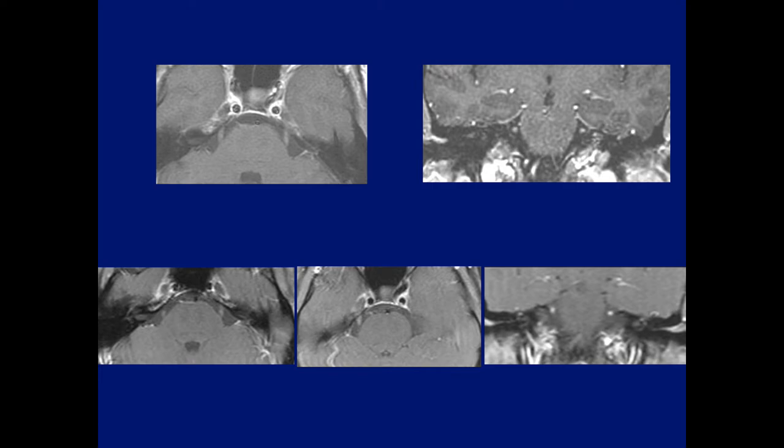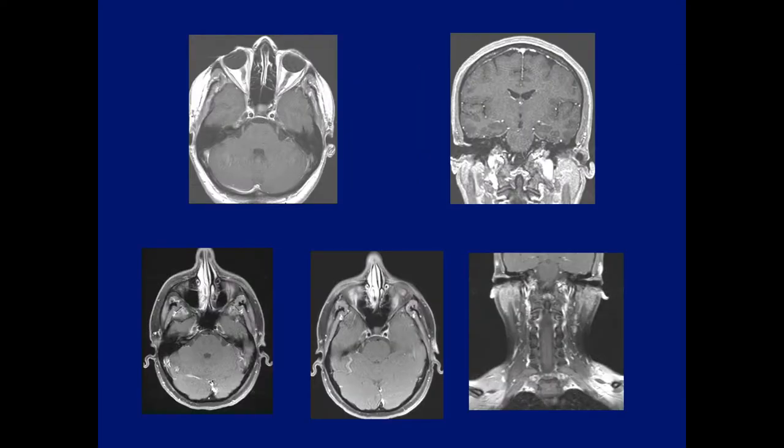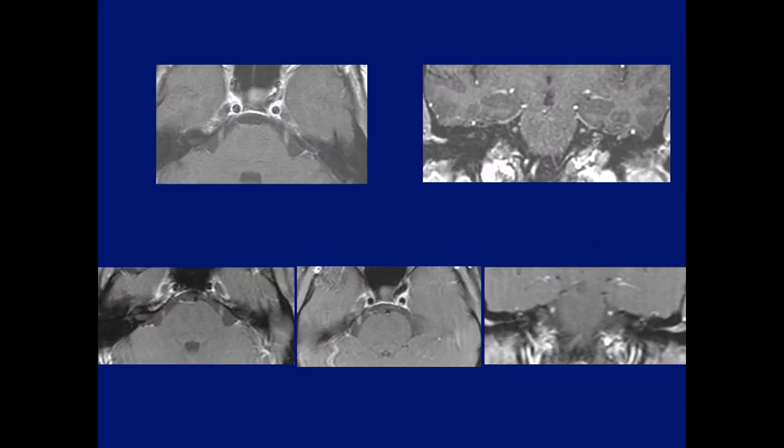Very good. Eric pointed out there's enhancement of the trigeminal nerve. And if you look, all these nerves are enhancing. Now, to go back to these images, this patient was studied twice, and no mention was made of the enhanced trigeminal nerves.